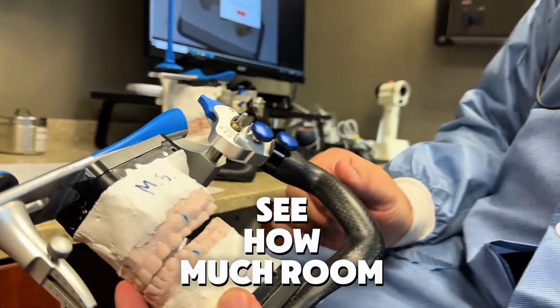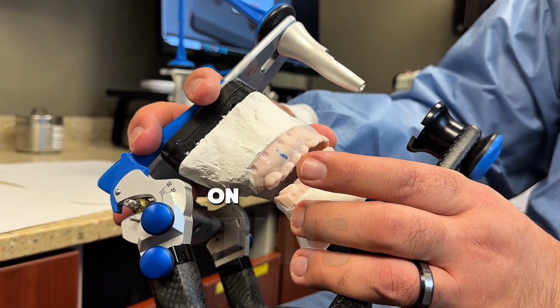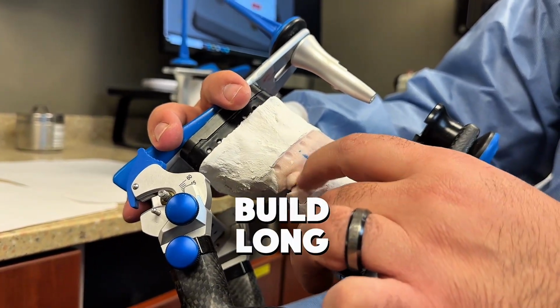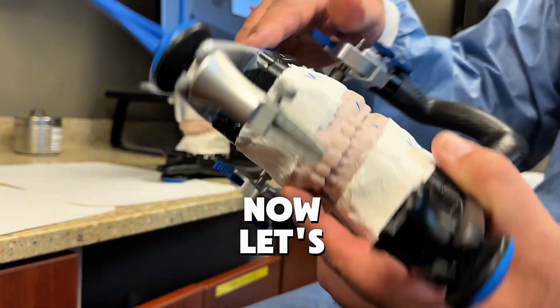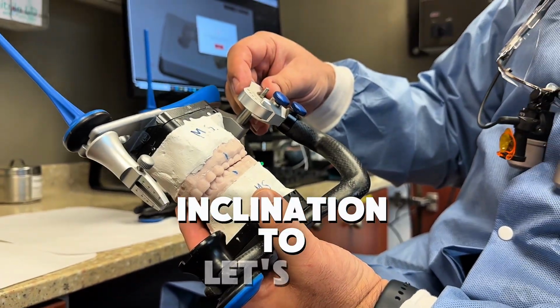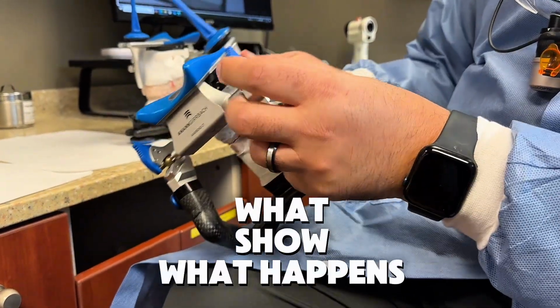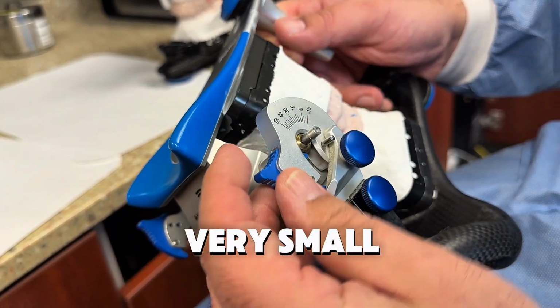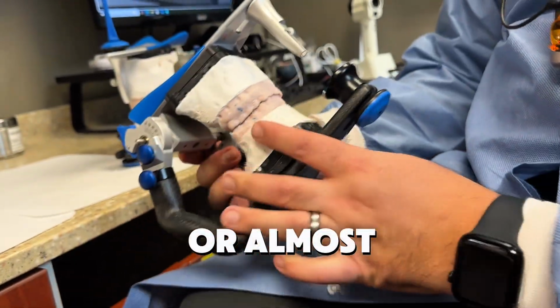It's two things. See how much room you have over here? Tons of room. If you go the other direction, how much room do we have on this side? Tons of room. This is the kind of tooth where you can build long cusps in the front and in the sides, and they're going to clear. Now let's say you screw up and change the inclination to 0 degrees or very, very low. That's 45 degrees. Let's change it down to 5 degrees, or almost 0.